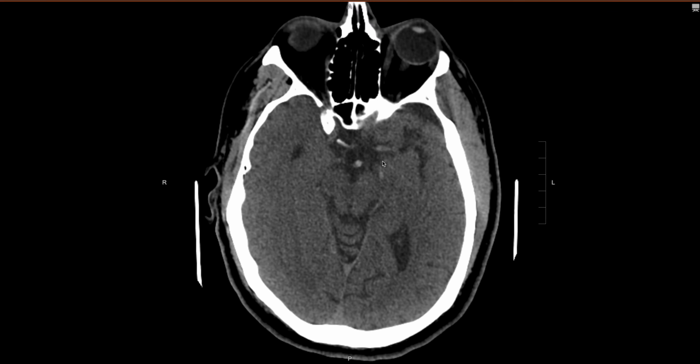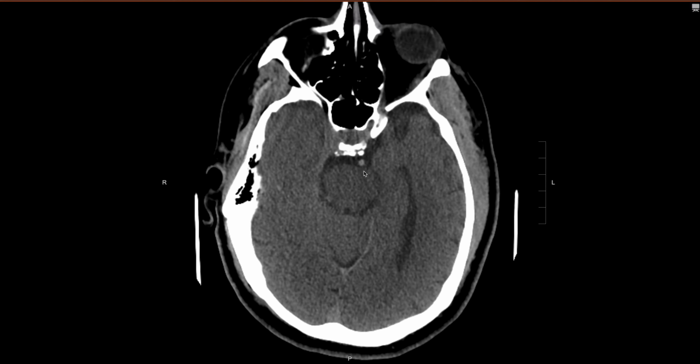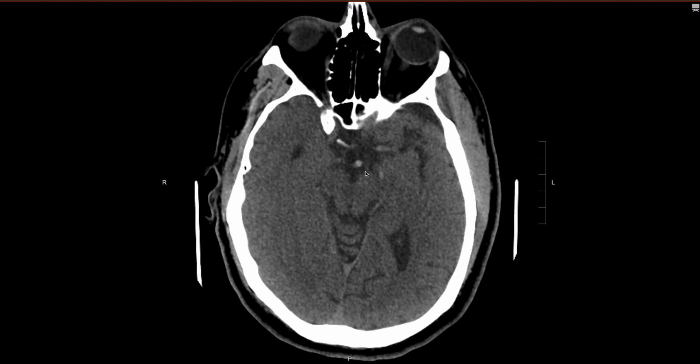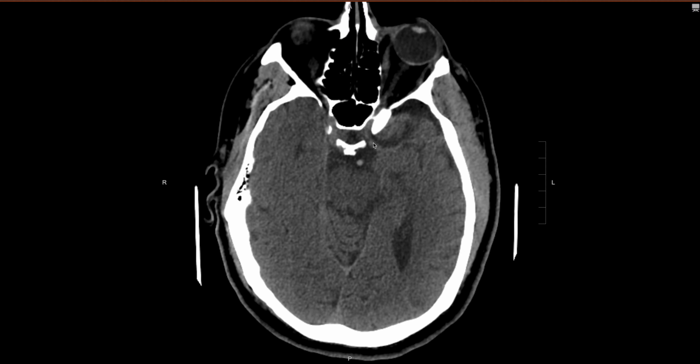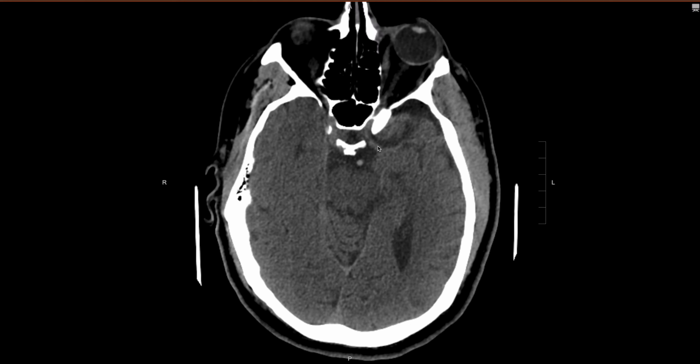So when you see this, there's a few things you can do. You can definitely put an ROI on here and measure the density. There's not a true cutoff. It more is just a gestalt where you look at it and you say, you know what, that's a lot brighter than I think it should be. And if you look at the MCA, it isn't quite as bright, which is right here. So it's out of proportion to the other vessels that you see.